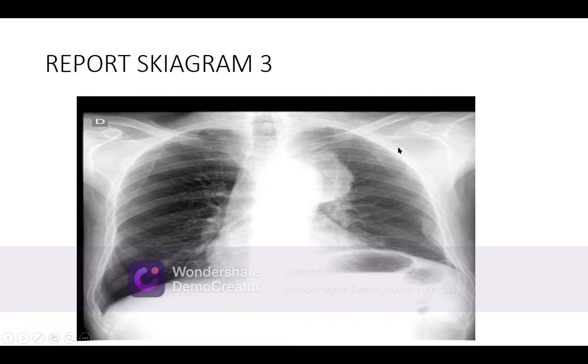So this is the scapula, the lateral border and the medial border are here and here. Okay, fine. Scapula, there is no problem. Shoulder region, there is no problem. Cervical spine, the intervertebral spaces are seen here, some of them. And there is no accessory rib present. The cervical rib is not present, so it is not related to the clinical scenario.